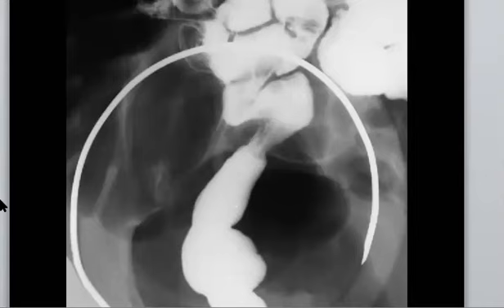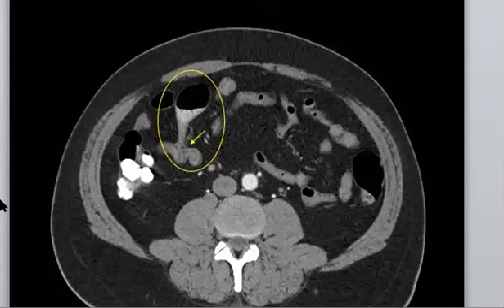So what happened here? They mentioned that there is a blind outpouching in the distal ileum. So if I mention to you a blind pouch, what happens in the Meckel's? Marwa, nice. Meckel's diverticulum, and this is a nice appearance in the CT.